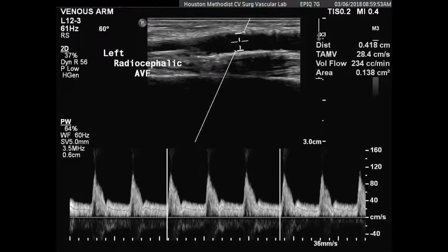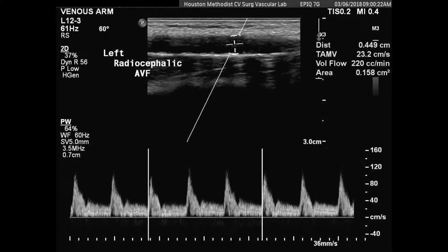And another guidance we need to emphasize that we do in our protocol is 3 volume measurements, and the 3 flow volumes need to be within 100. I think that's another way of controlling that. If your flow volume is, let's say, 200, 400, and 800, there's something wrong with the technique and the measurement spot. So this is where I want you to have at least those 3 measurements, but within 100 cc apart.